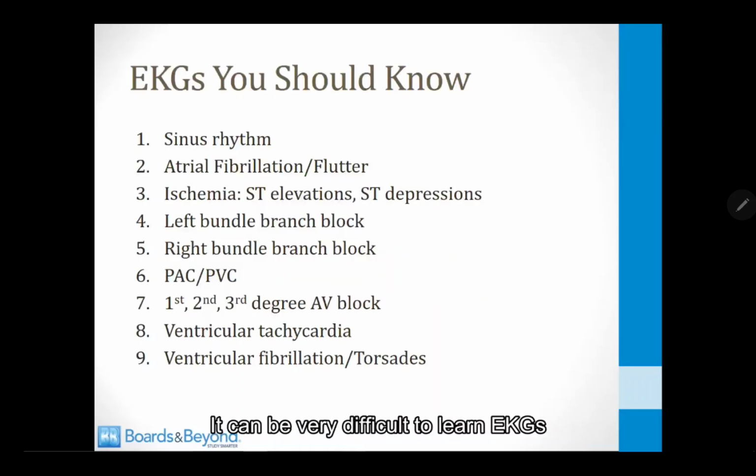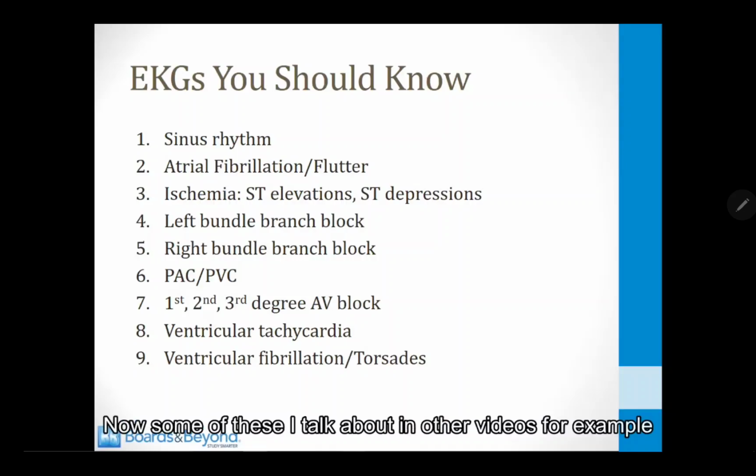It can be very difficult to learn EKGs as a medical student, and one of the reasons is because there are so many potential findings. What I've shown on the screen are 9 EKGs that I think medical students should be familiar with. These are the type of EKGs that may come up on the Step 1 exam. They're also the type that you may be shown as a third-year student on rotations, and you ought to be able to recognize.